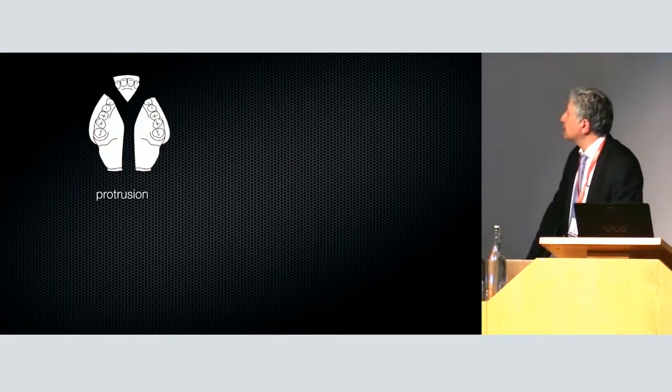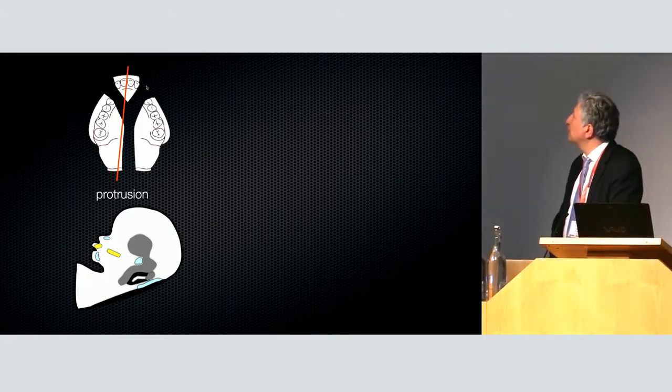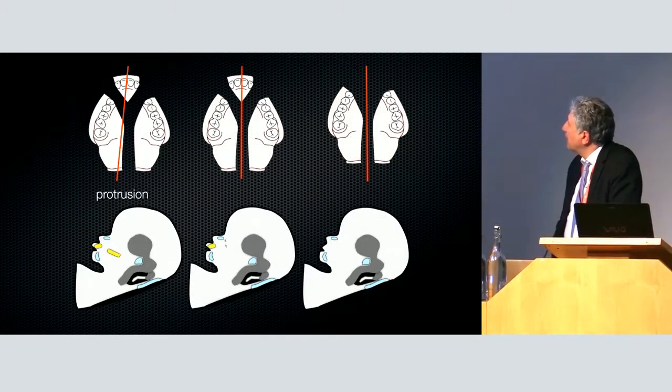So the theory is like this. It depends if you have a protrusion like this. We are almost never in a true mid-sagittal view. So if you have such an oblique view, you will have a protrusion. You see here the anterior part, and you have a gap, and you have a posterior part, or you may have only the anterior part seen and something absent behind.